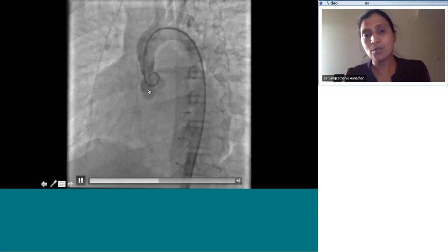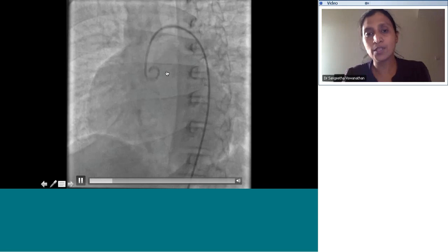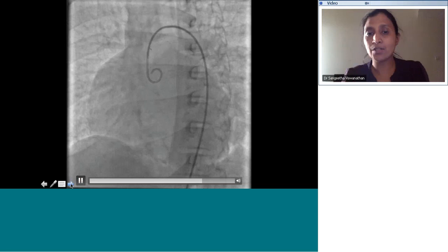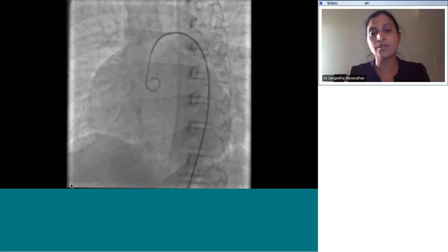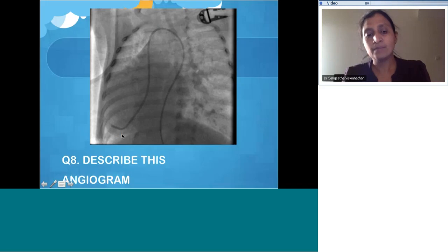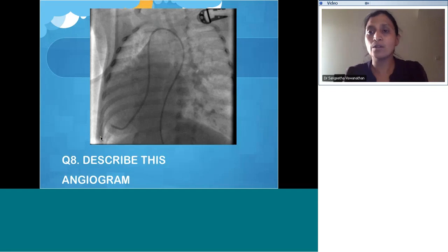So I don't think there are any doubts, and you can see how close to the obstruction the coronary arteries are. And sometimes it's necessary to do selective injections in different projections to delineate the coronary arteries clearly. And surgery is the only treatment really. Patches are applied. There are different techniques, but often multiple patches have to be applied over the constricted area to widen the supravalvular portion.